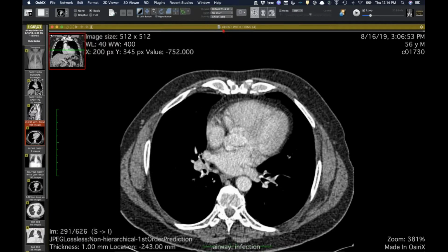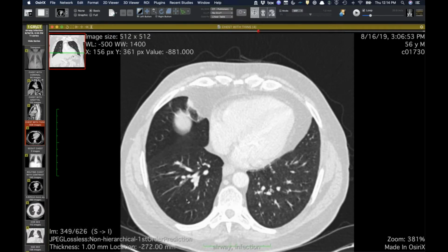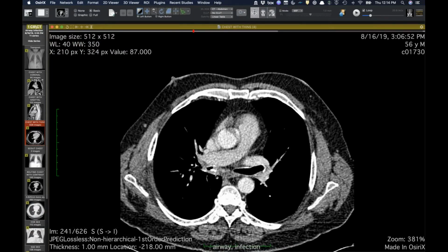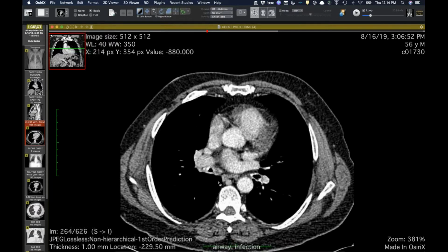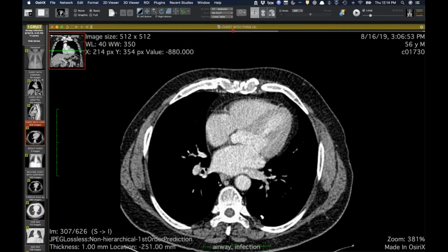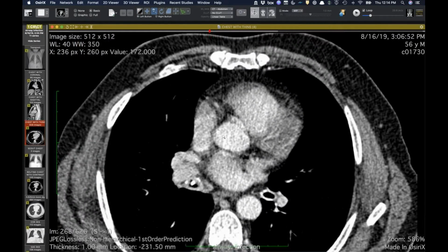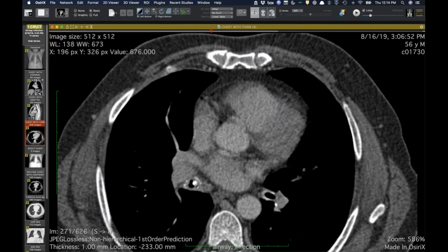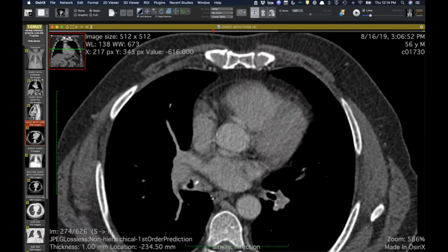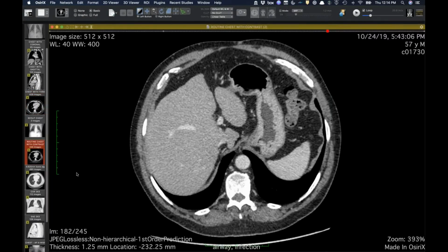And at the outside, they saw that there's some plugging in the airways here on the right side, some mucus impaction throughout. And then they saw this in the right mainstem bronchus and thought it was a calcified mass. And at the outside, they actually did a transbronchial biopsy and got squamous metaplasia. So they transferred him here with the suspicion that he had an obstructing tumor. Now I'll show you, you can look at this and see that it doesn't look like a typical tumor. There's some weird curvilinear higher attenuation thing here. And I'll show you the follow-up CT that we did here.